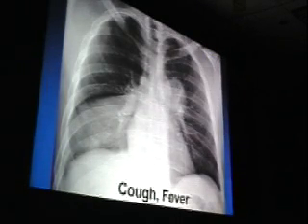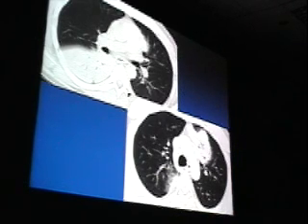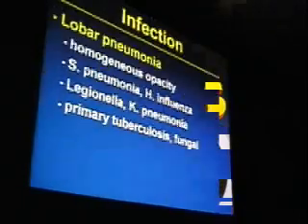Patient presents with cough and fever fairly acutely. We have a homogeneous right lobe opacity, like perihilar opacity. Show the CT not to suggest that we ought to be CTing patients with pneumonia, but just to show very nicely a bronchogram sign typical here of an airspace filling process. Again, our differential might be very broad, absent much clinical information, in the setting of cough and fever. This is clearly an infectious process that looks like a lobar pneumonia.